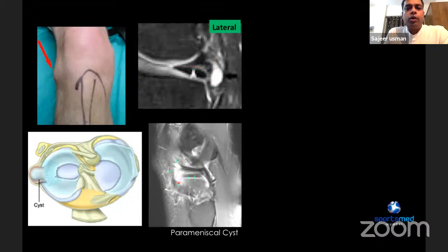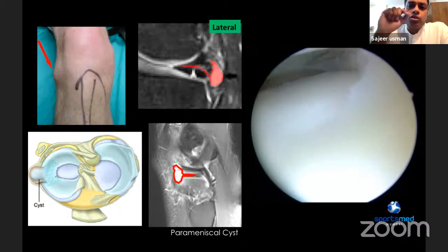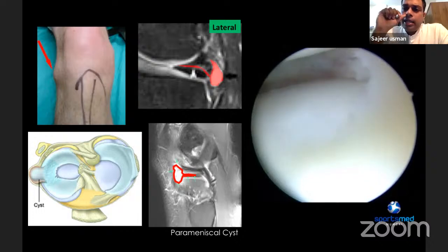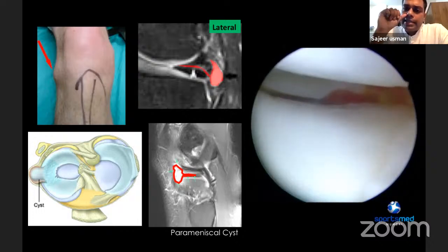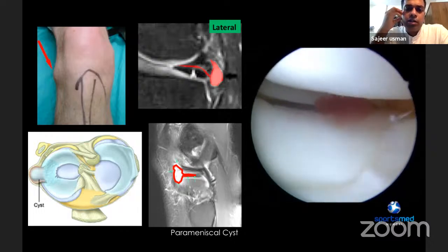On having a lateral meniscus cyst, the only additional procedure in addition to the lateral meniscectomy that one needs to perform is a cyst decompression. This is done in various ways by various surgeons. What we prefer is just passing an outside needle and decompressing the cyst fluid into the joint. So the MRI can be helpful because you can find out where exactly the cyst is located. Is it adjacent to the body or the posterior horn or the anterior horn?